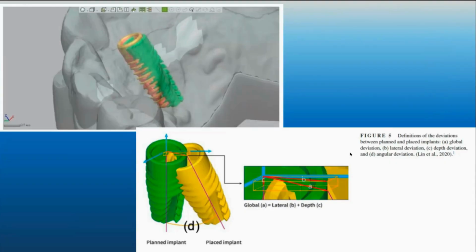It's not just for placing implant to implant, but it's also making sure that we're away from any vital structures. We're not radiologists here. We're just software navigators. So we have our tools to keep us safe, but then of course you can have a look at the plan from there. So when we talk about accuracy, this is all dependent on the fact that the surgical template sits passively on top of the teeth, in this case, or the soft tissue. We need that repeatable from what we used from the scans that we received. We need to be able to transfer that to the mouth.